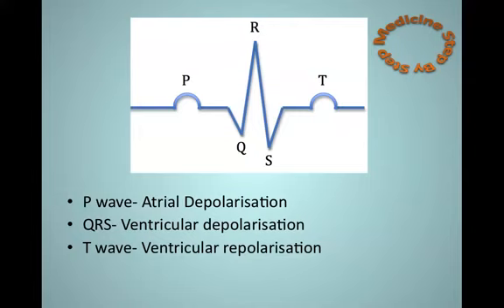On a side note, what you'll immediately notice when looking at a 12-lead ECG tracing is that at different parts, these complexes look different. This is because each part of the ECG is looking at a slightly different area of the heart, determined by which ECG lead that part is representing.